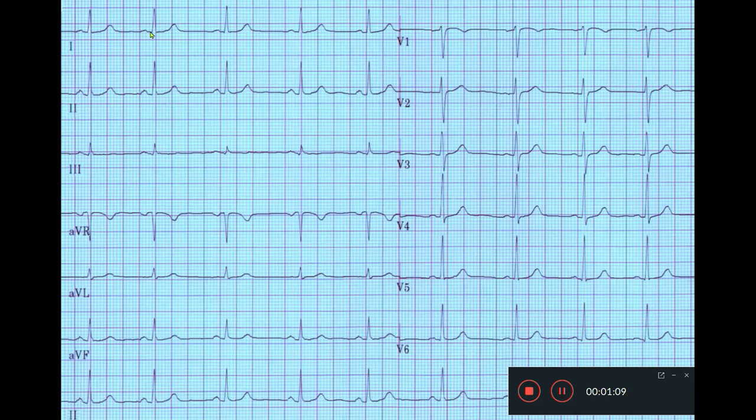It will also have a P wave, a QRS complex and a T wave, but the shape of the P, QRS or ST might be a little different from a normal complex whose impulse comes from the SA node.